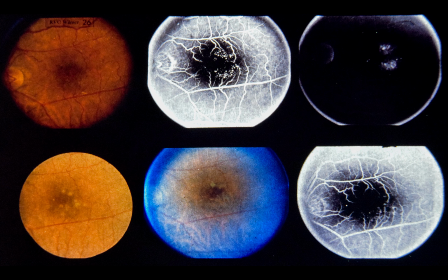Lower center and lower right photographs were taken 3 years after treatment. The 2 microaneurysms that fluoresce in the post-treatment angiogram, lower right, did not leak in the late phase of the angiogram. Staining of chorioretinal scars is also seen in the post-treatment angiogram, lower right.